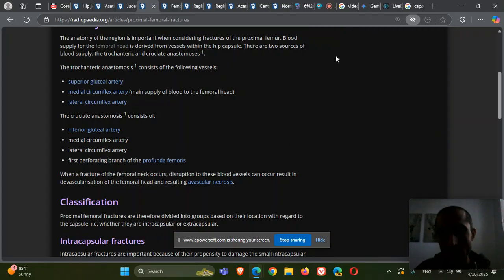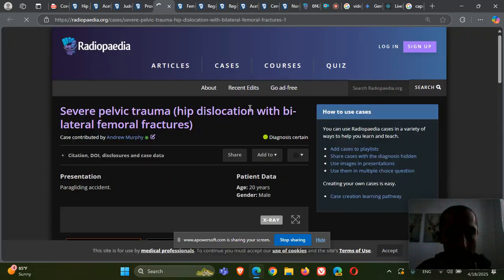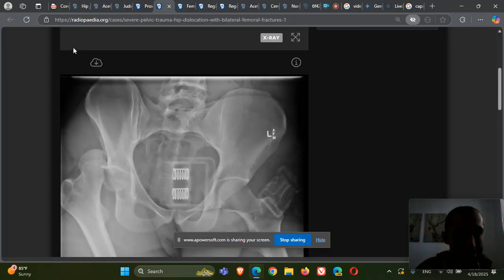Great. Again, when you look at fractures of the femoral head and femoral neck, let's see some of them. You can see what this is: a total dislocation. Usually it dislocates posteriorly, and in fractures, this is a total posterior dislocation, maybe with a little bit of valgus displacement.